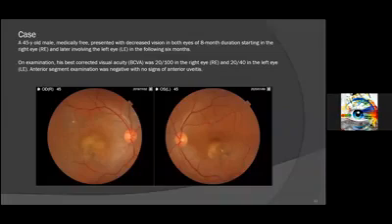But in many cases, ICG is more sensitive than OCT. Even in recurrent cases of Vogt-Koyanagi-Harada, they studied a group of patients, and in some recurrent cases, they found that the choroidal thickness at the macular area was not increased. However, the disease was active. So ICG is more sensitive and better than OCT in any inflammation involving the choroid. But in my clinic, I have no access to ICG, so I depend on swept-source OCT in follow-up of VKH cases to detect any recurrence of the disease.